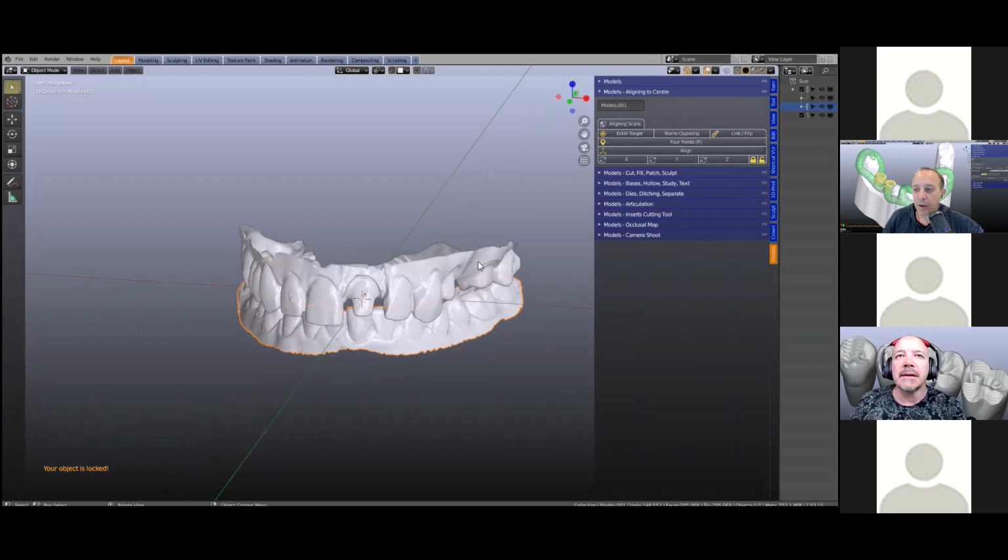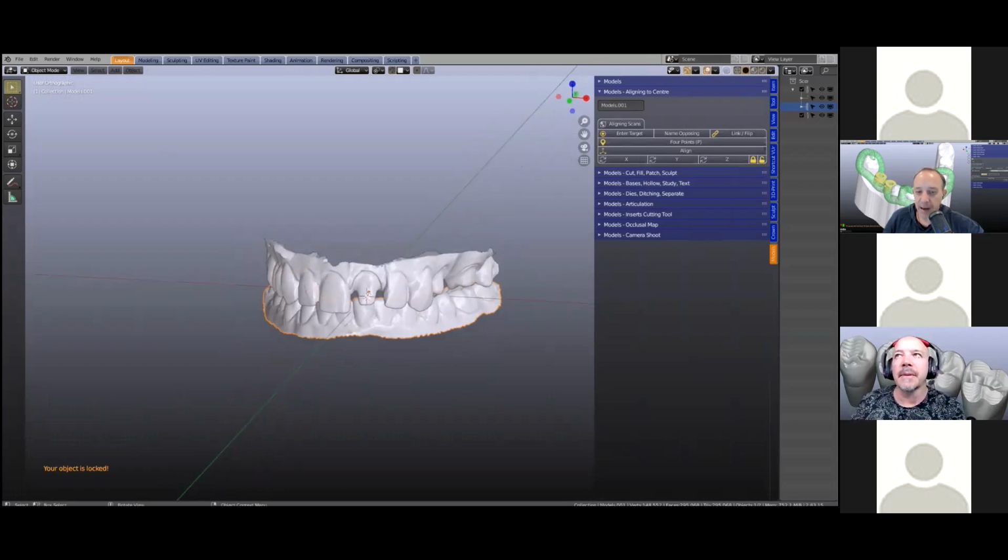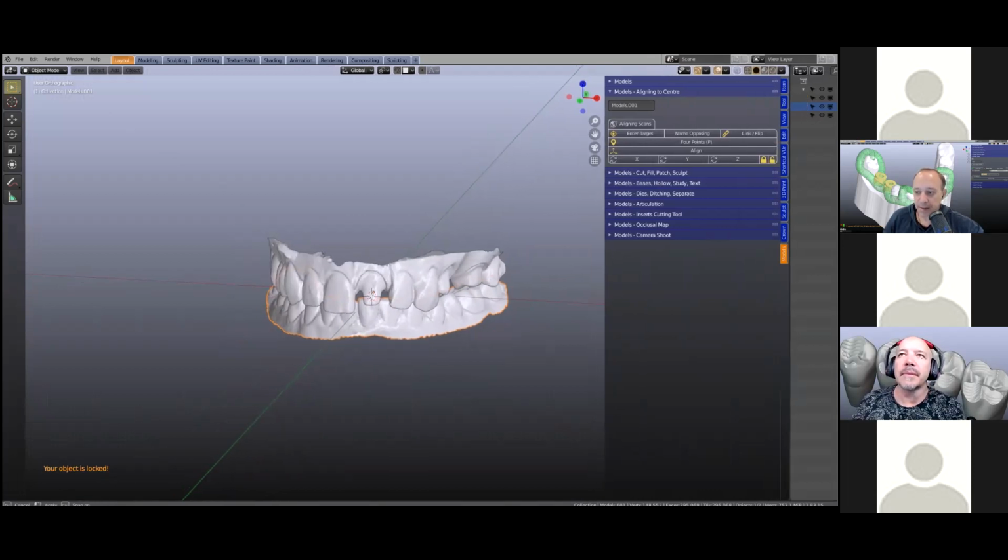So Michael, how do you go back? When you've shifted the scan upwards and then you go back, you use Control Z, don't you? Yeah, that's a common Windows key, Control Z, to go back. Please don't try the escape key, because you're going to be sitting there all day trying to go back and it isn't going to work. So just remember Control Z, okay?